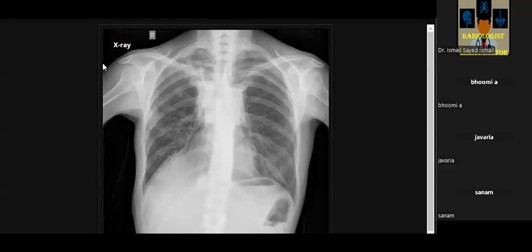Yes, sir. I'm provided with a frontal chest radiograph of a skeletally mature patient. I can see lobulated soft tissue opacities in bilateral hilar and suprahilar regions and in bilateral lower paratracheal regions.